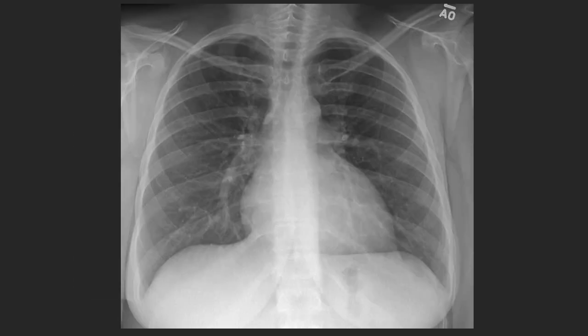So let's talk about some lines and stripes in the chest radiograph. One of the ones that I always look at is the right paratracheal stripe. This is where the lung contacts the right lateral border of the trachea. This is typically really thin, less than 4 millimeters. Processes that can thicken this include lymphadenopathy, as well as blood and fluid, so mediastinal hematoma, or in the setting of interstitial pulmonary edema.